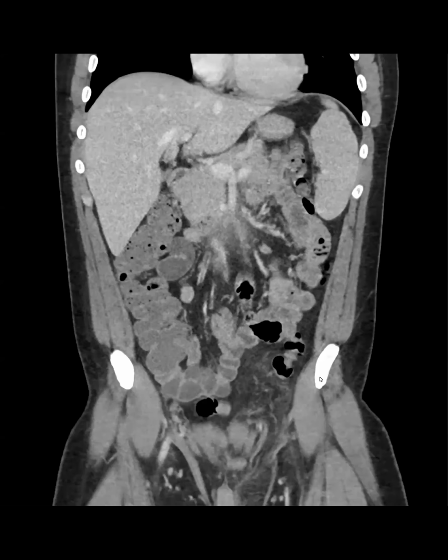So here we got an angiogram subsequently, and you can see the SMA is almost entirely out, but the bowel looks okay. Later they took the patient to the OR to try to revascularize it, but they found the segment was too inflamed, so it wasn't going to be safe to bypass. The bowel looked normal and pink, so they decided to not do anything. The patient did well, and this was a follow-up after discharge. You still see occlusive thrombus, but the bowel looks fine, because this patient has a pretty robust collateral.